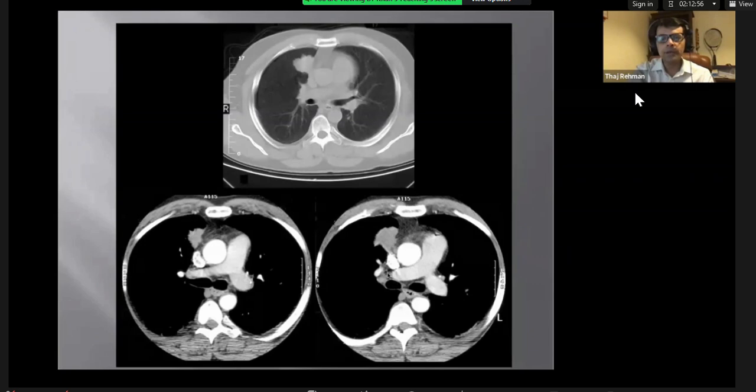The hilum is the point where the bronchovascular structures enter the lung. So on the right side, especially, what's anterior and what's posterior is lung tissue. You see, so that's lung tissue. On the left side, there are more cardiovascular structures, but even on the left side, if you look here, there is lung. So something that sits anterior or posterior to the hilum in the hilum overlay sign refers to a lung lesion that's close to the mediastinum, as you can see.